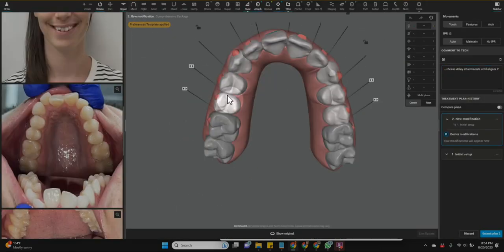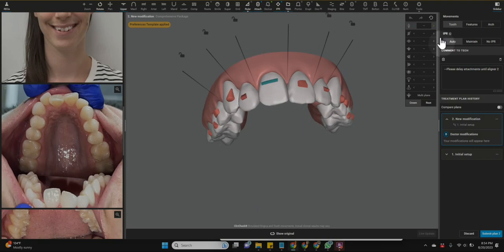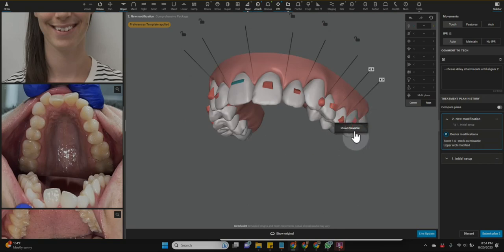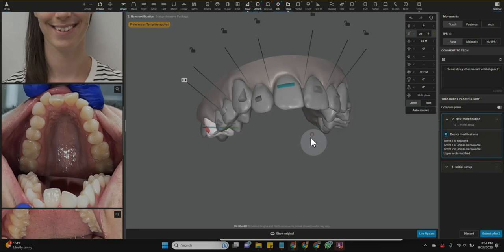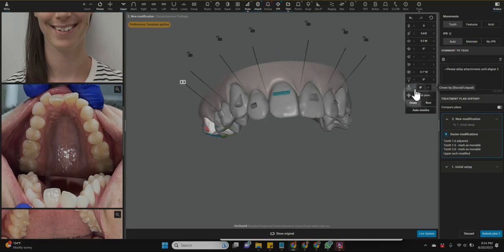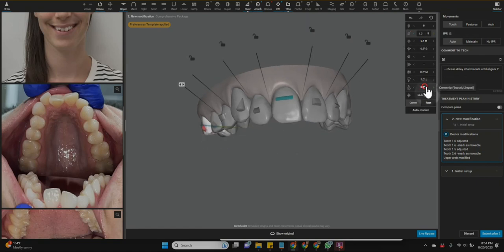So I'm going to show how I would treat these molars. So knowing that molars will tend to tip buccal, let me give you an example. When doing molar pure translation, the tooth will end up clinically doing this type of movement as well. And although we want to upright it, just like we want to do more uprighting and translating of the premolars, what I've also seen is this effect happen clinically.